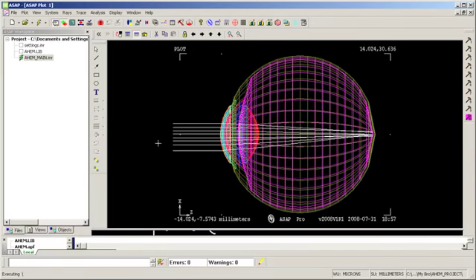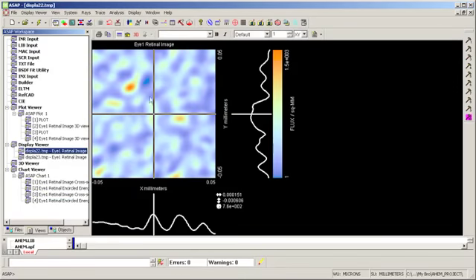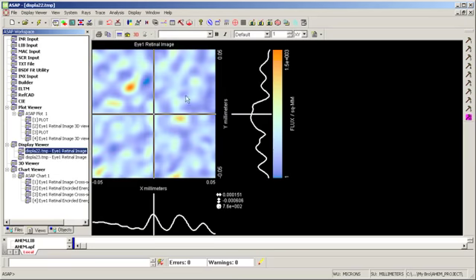And it's not the greatest correction, but it demonstrates the use of a contact lens that I created in CAD. Let's look at some of these views. So here was my original horrible image of a point spread function. With my contact lens correction, I was able to make that pretty compact for a point spread function. Still have some issues to deal with here with some astigmatism, and I could get that a little tighter. But it's not a terrible PSF for the correction that I made here.